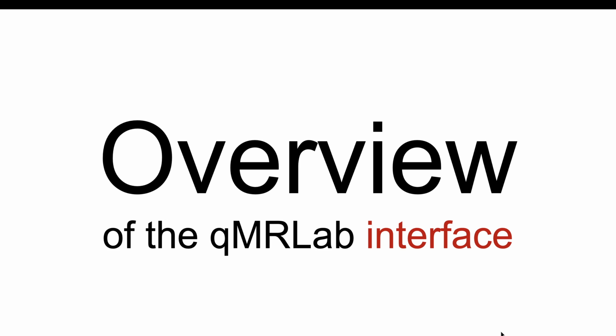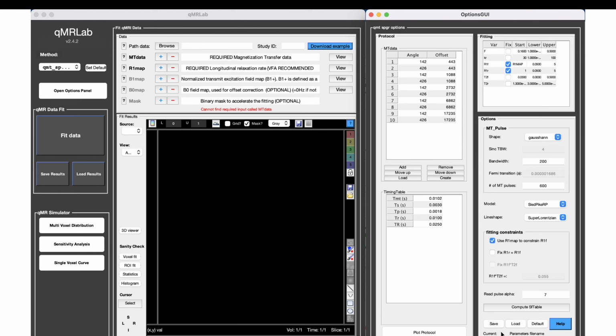I'll give you a brief overview of the qMRLab interface. On the left panel here is the main window for qMRLab. Here is where you'll select the different methods that you want to use, whether it's qMT, T1, or B0. You can load your data here, visualize it, and get some statistics on it. This is where you'll start fitting the data or saving and loading some results. You can also select some of the simulators as well. On the right panel is the options graphical user interface.